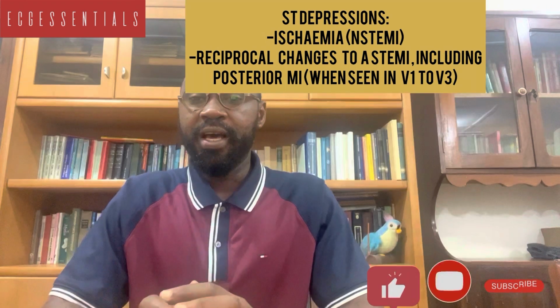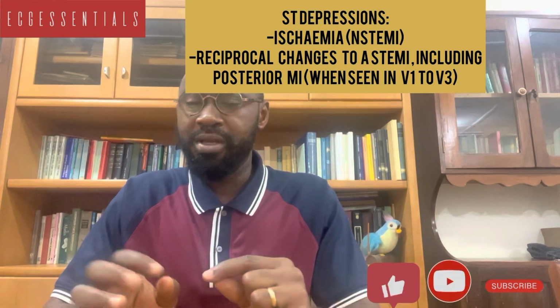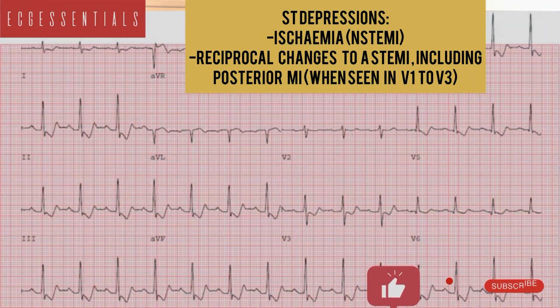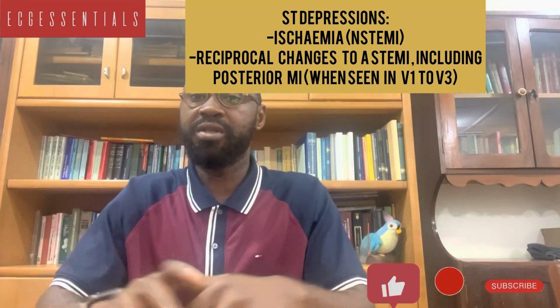Because usually, with respect to an NSTEMI, these ST depressions may not necessarily localize to any of these leads. So if we see them in such a manner, then it should prompt us to go and look for some ST elevations in those other leads that are mirror leads to those leads where we find the ST depressions localized.